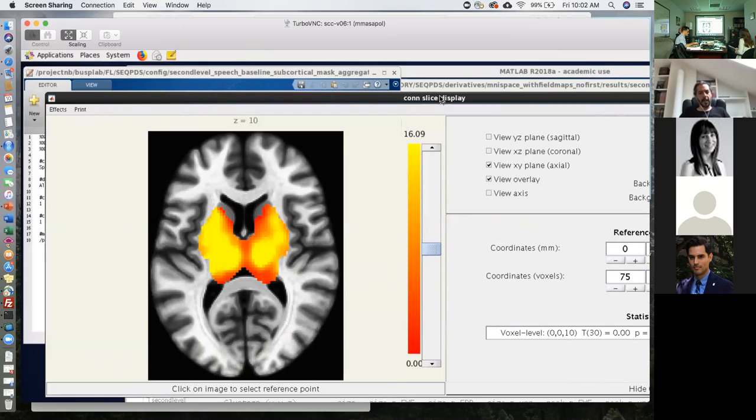In general, this 80% of the global signal threshold that SPM uses works relatively well, and we can actually look at first level. If you want to look at this in more detail, we can look at the first level results for some of this data. Actually, why don't we do that briefly?